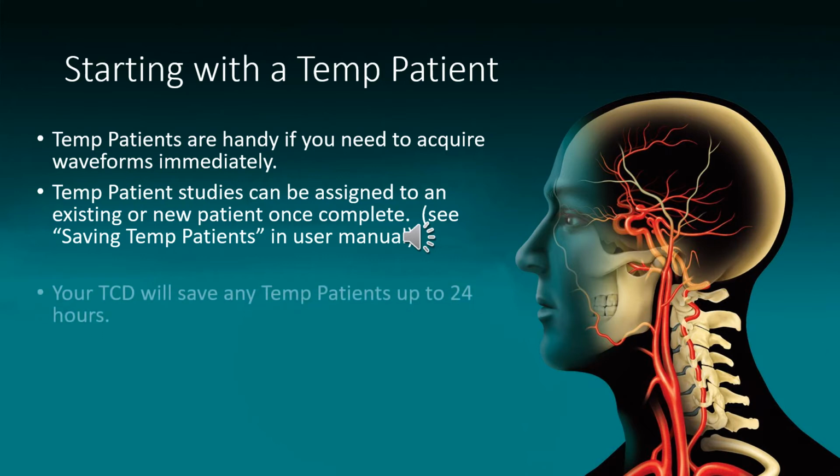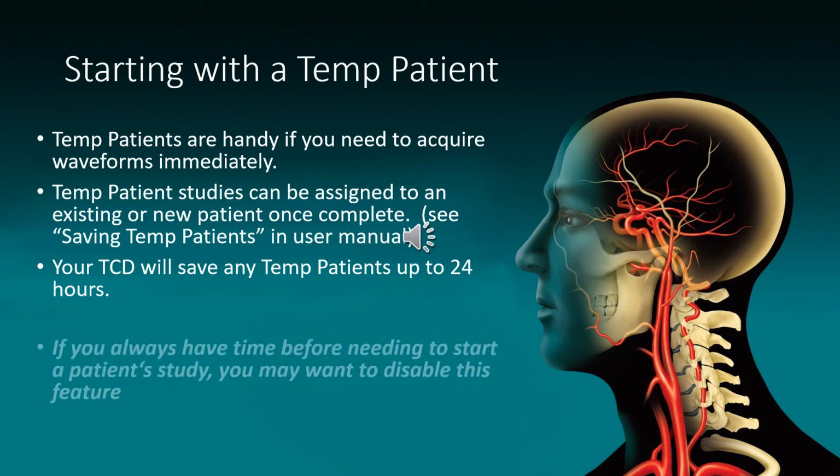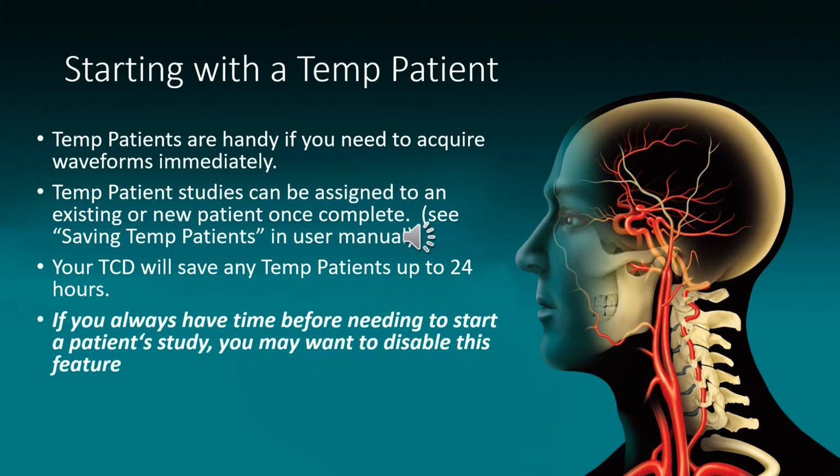Your TCD will save any TEMP patient data for up to 24 hours. After that, it will be deleted. If you have adequate time before having to start any patient study, you may want to disable this feature.